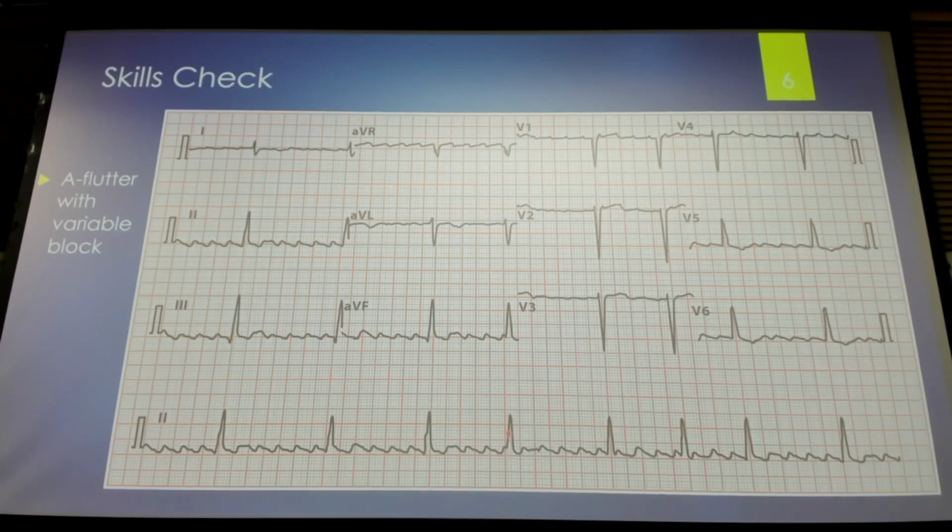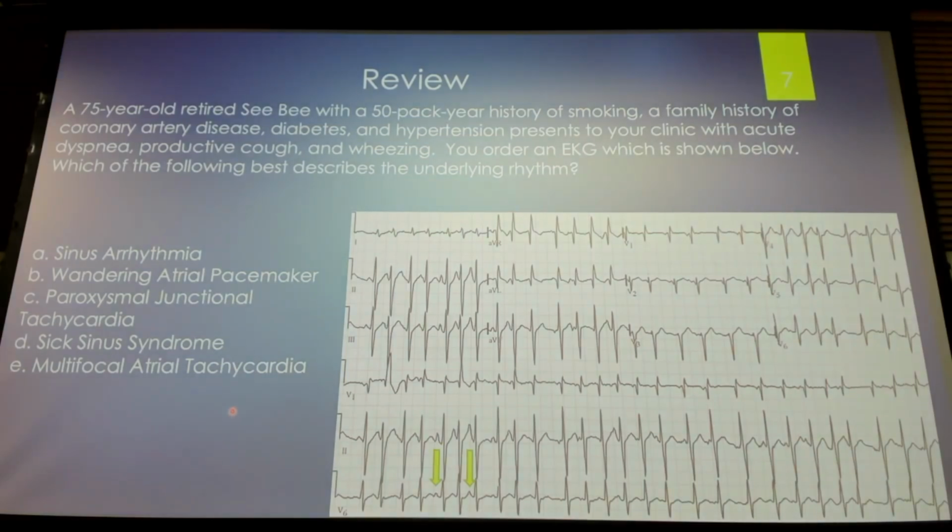It's hard with atrial flutter because sometimes that will happen, but certainly that's something good to point out. We haven't really talked about that. We'll talk about that either today or tomorrow. But these QRS complexes should go straight up and straight down. We can see we have a little bit of it convex here, then goes concave, and then here it's convex and it's concave. Yeah. Okay.